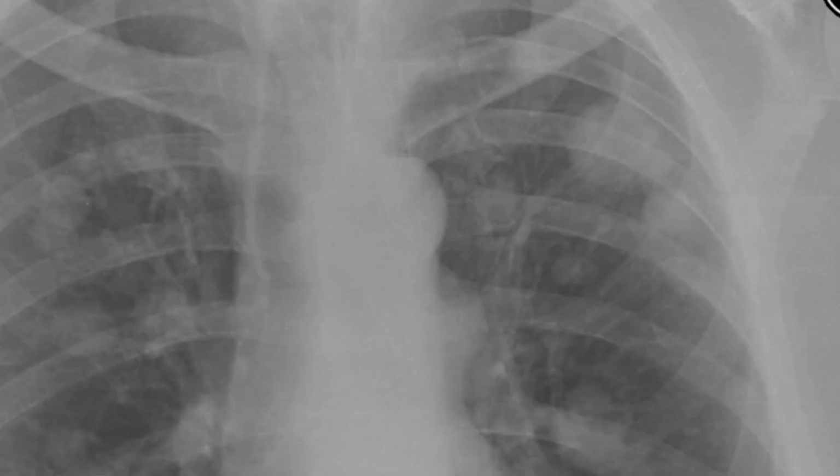Therefore it can't be a bone lesion. I've done a zoom of the chest radiograph and it clearly shows that the diamond, which is the area which doesn't have bone overlying it, contains the nodule. And it tells me without a doubt that this is unlikely to be a bone lesion, otherwise the bone lesion would just be confined to where the bone is. So it tells me there's a skin lesion or a lung lesion, and because I don't see any lesions outside the lung fields, it must be a lung lesion.